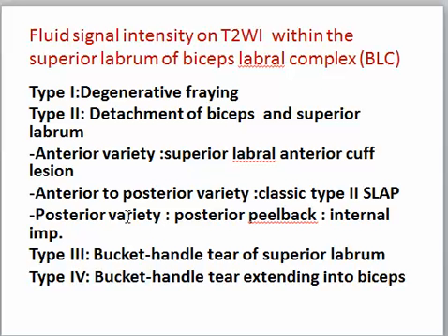In other words, without memorizing all of this, fluid intensity within the superior labrum at the region of the biceps complex denotes a lesion of the superior labrum and attached part of the biceps tendon. It could be a degenerative fraying, detachment, classic SLAP, anterior cuff lesion, peeling back, or bucket handle tear of the superior labrum or its surrounding, extending to the biceps.